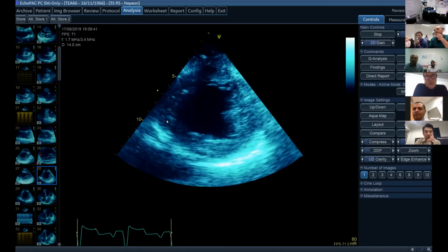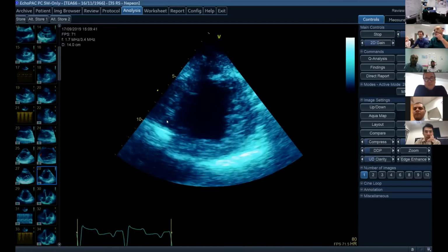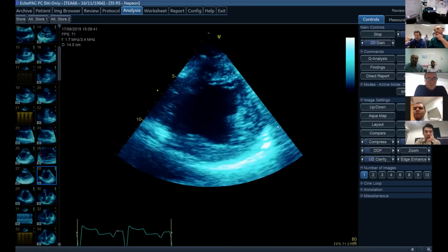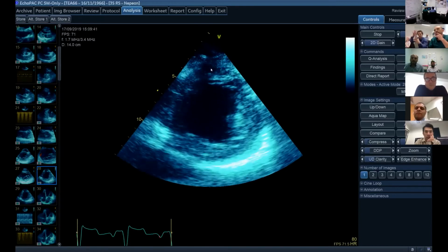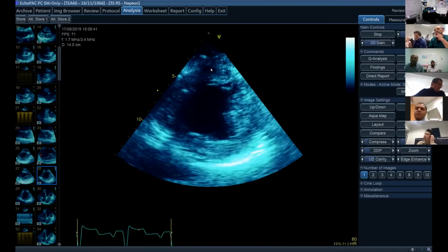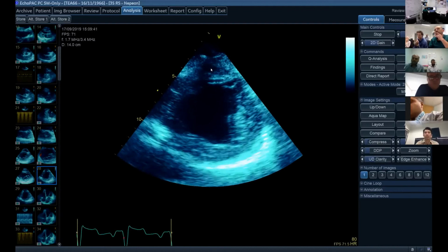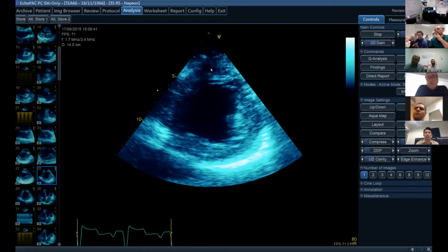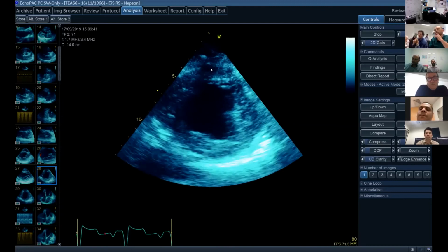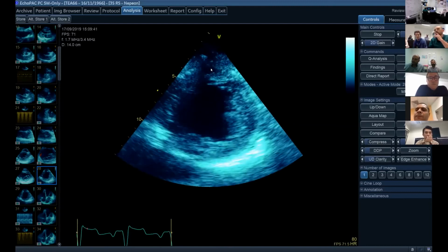Be really wary of talking about abnormalities outside of a coronary artery territory. It can't be that one thing's dodgy over here and another one's there and it's sort of scattered around. That doesn't make sense. So it's got to be in a coronary artery territory. Then talk about acute versus chronic changes, so looking for that thin scarred myocardium versus normal thickness myocardium, and then talk about the coronary artery territory you suspect is involved.